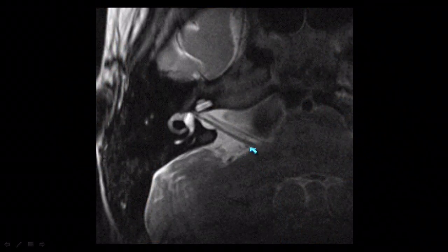So on imaging, we see here again there's 2 nerves coming out. So the big vestibulocochlear nerve and the smaller facial nerve, both going over to the IAC. So on our CSF bright sequences, whether you're doing a KISS, a T2 FSE, a SPACE, a Fiesta, whatever sequence you have with your vendor, we have the nerves very nicely shadowed here. And if we have vascular loops, we look for those flow voids around it.